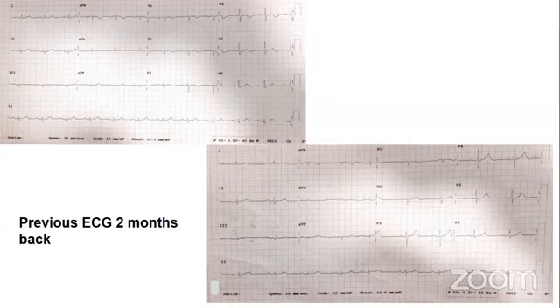Okay. I'd like to request Chaudhry Hafiz sir to speak. I'm very impressed. It's important to recognize this nature, because sometimes there is a deep T inversion, more than 3, and we need to distinguish the cerebral T wave from Wellens. This is a classic biphasic presentation. So it is a proximal ostial LAD until proven otherwise. And if the clinical picture fits, then go for it.